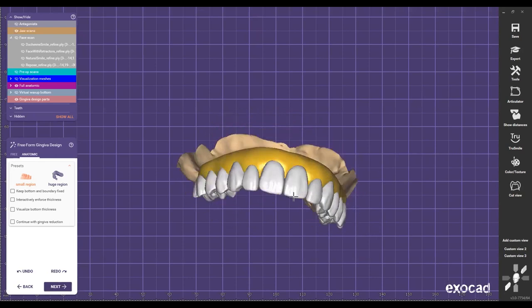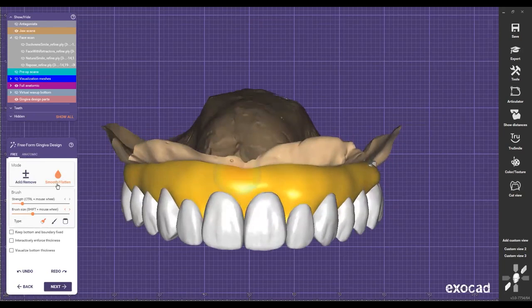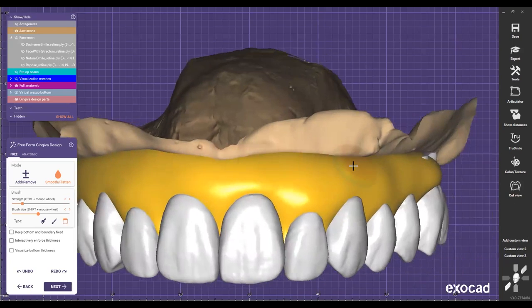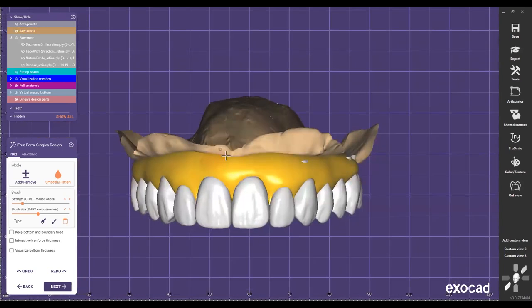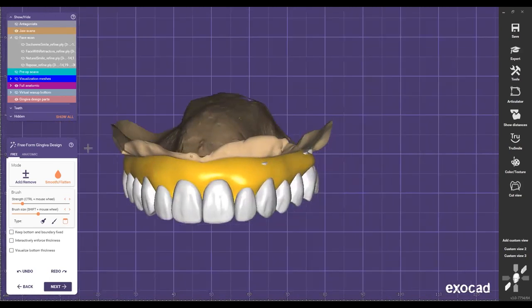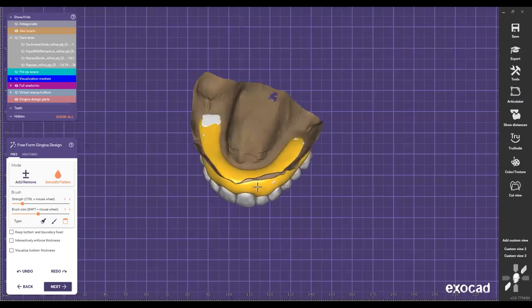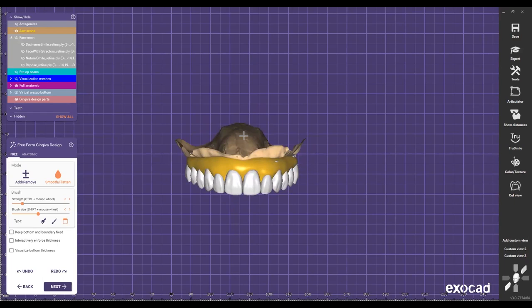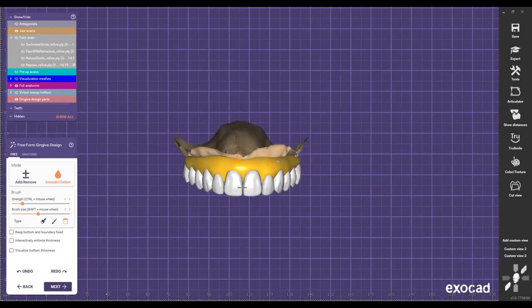So once I have a nice ideal design, I don't want to go crazy yet with the gingiva, because remember, if you don't communicate with the doctor, and the doctor doesn't cut enough bone, it doesn't matter if you make a nice, beautiful gingiva shape, because guess what? You're going to have to destroy it, because the doctor didn't cut enough bone. We didn't communicate that to the doctor. So now we spend a lot of time on nice characterization of the gingiva when the doctor didn't cut it, because they didn't know, right? But if you communicate that information, say, hey, doc, I checked the CBCT and we can cut up to here, but you guys are going to be reviewing that case before surgery as well.